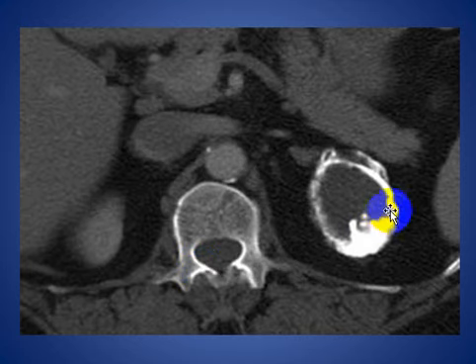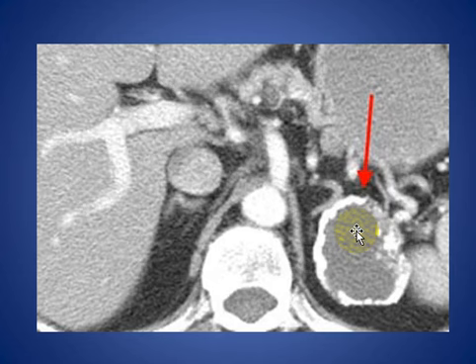Here, another thick calcification is noted on the left adrenal gland due to pseudocyst. Here, another patient with heavy calcification involving the left adrenal gland on enhanced CT scan, probably due to prior hemorrhage. However, infection can be in the differential diagnosis, and we see the calcification is on the wall.